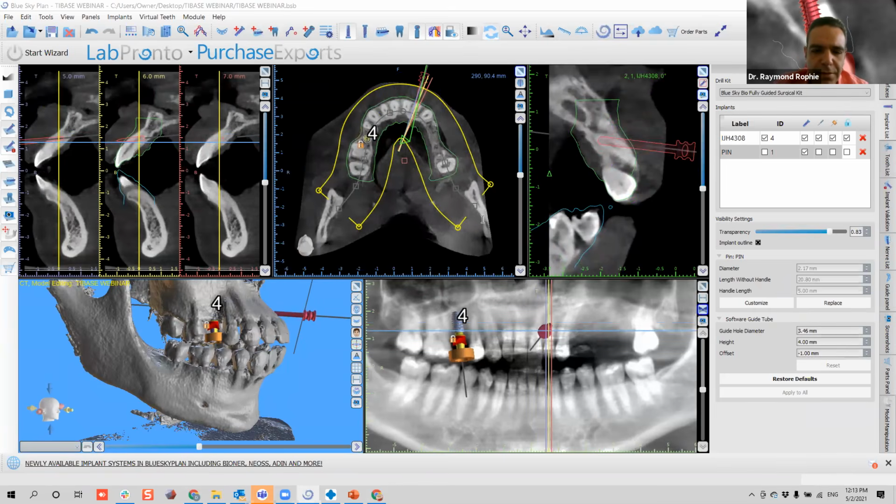Well, I think that's it. There's a ton of questions regarding the healing abutments. So yeah, you're planning the abutment and a crown. Well, if there is anything else, I'll be happy to answer. And can you do the healing abutment without designing the crown?